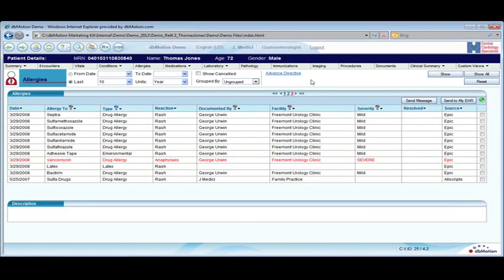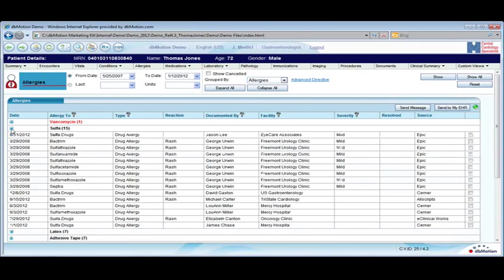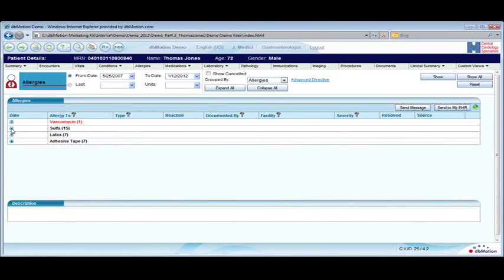So this is not our default view. This is how other people tend to provide HIE data. I'm showing that just for illustrative purposes. Our default view is this. So that semantic piece is, I know all that stuff we do is sulfa, and we can roll it all up under a single category. So a much more palatable list here. And again, that vancomycin allergy now pops up to the top of the list because of that.